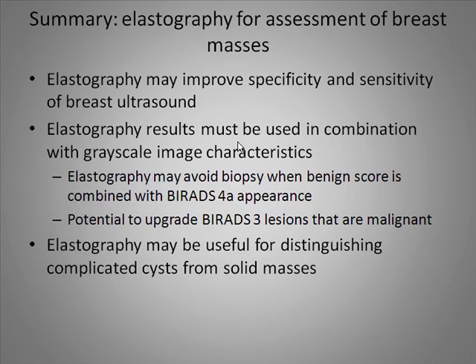So in summary, elastography shows great promise for assessment of breast masses because it may improve the specificity and the sensitivity of breast ultrasound. Elastography results must not be used alone, however. They must be used in combination with grayscale image characteristics.